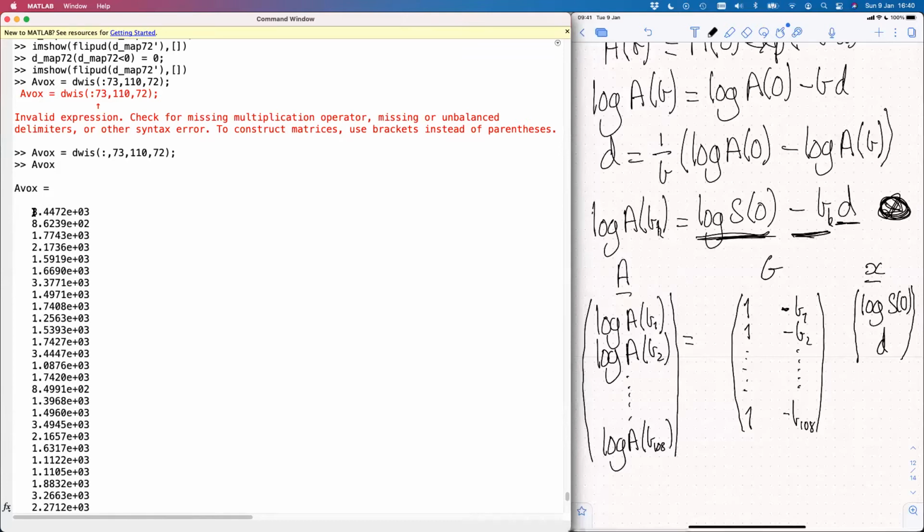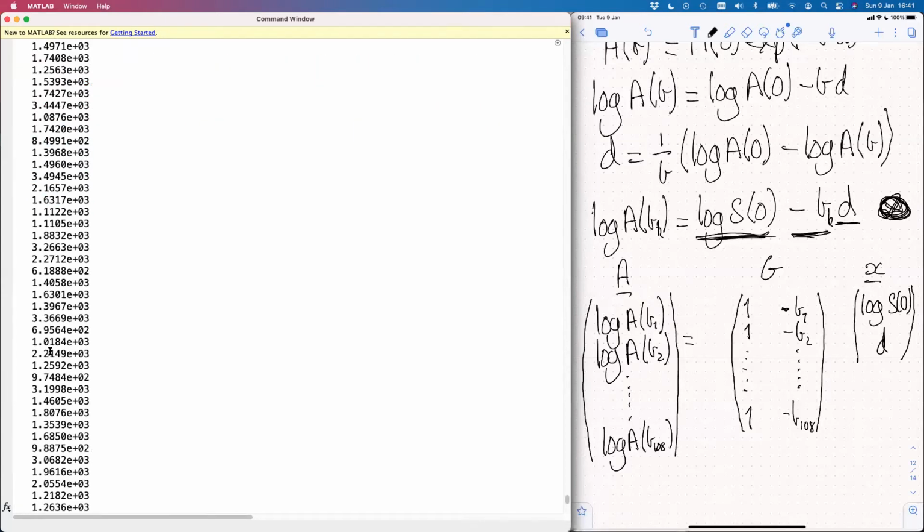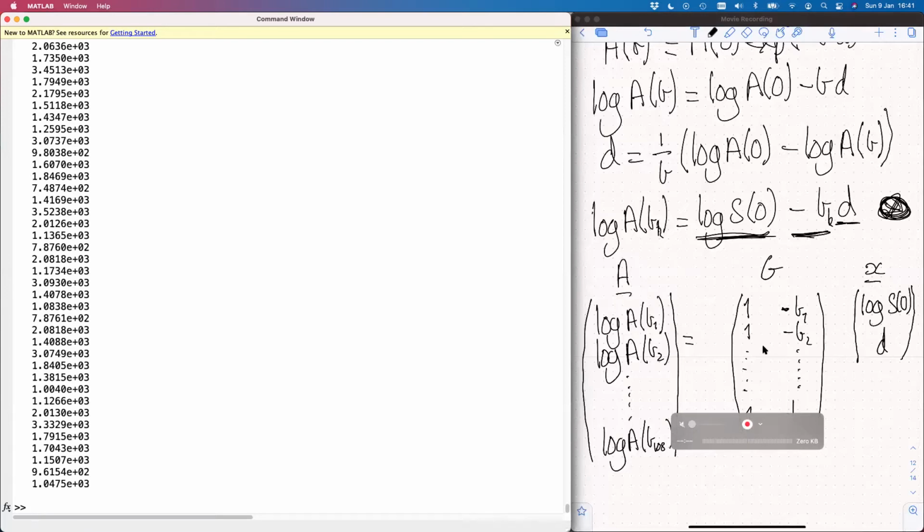And you'll notice, if you look at this carefully, that every 6 or 7, we have a higher value of sort of 3,500 or so, compared to the intervening measurements, which are typically 500 up to 2,000, something like that. So you'll immediately realize that these, of course, are the B0 measurements, whereas the smaller ones in between are the B1000 measurements.